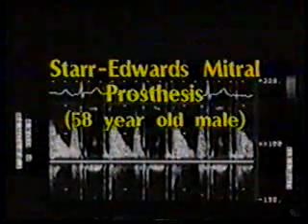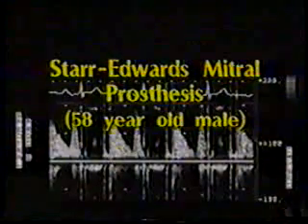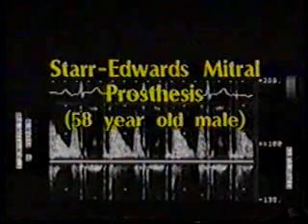Despite having a ball cage mitral prosthesis for 5 years, this patient has remained in sinus rhythm. By CW Doppler, the early velocity peak is 1.5 meters per second, and the atrial velocity peak is 1.8 meters per second. The end diastolic velocity at the closing click is much lower, 0.3 meters per second, indicating no end diastolic gradient.